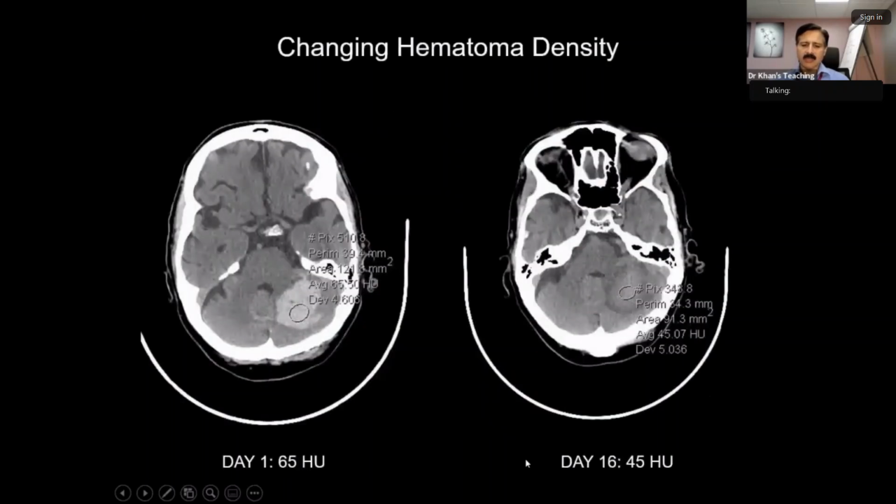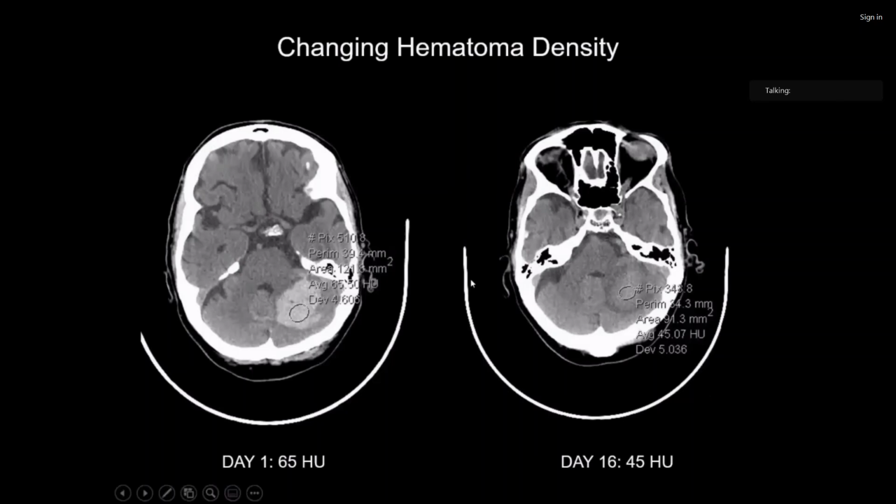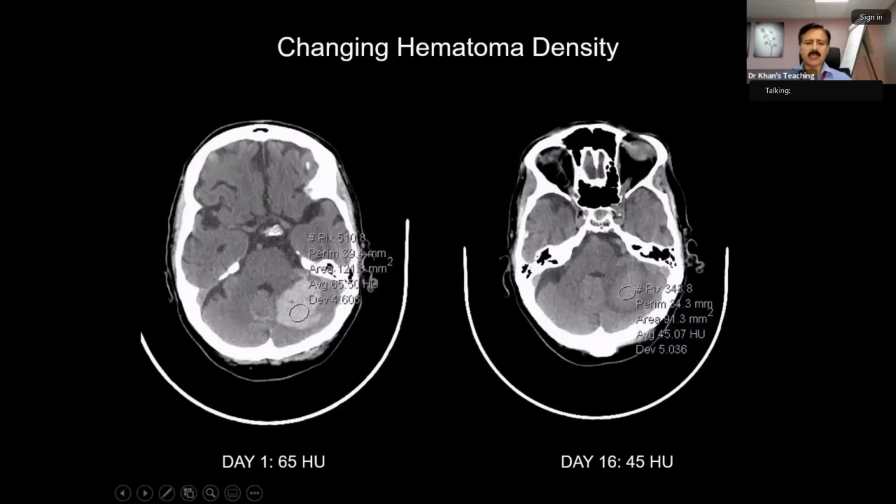So candidate 6, can you now see my screen changing, hematoma density? Yeah. Okay. So this is a teaching slide. Basically in trauma, we will go very fast. But the idea is to show you many things. And most of this stuff, you know it. But in the exam, what happens is they might show you subtle things which you might not pick up. So this is what I mean by develop your eyes and your thinking about what can be asked in the exam.